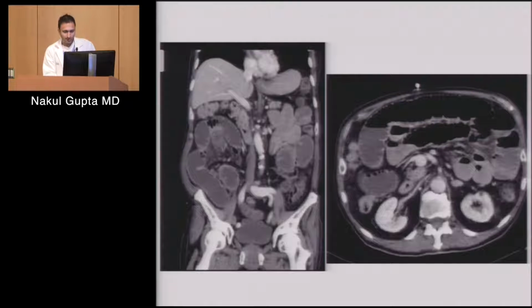And another area where CT is helpful in small bowel obstructions is to find the underlying cause. Again, mostly it'll be adhesions, and what you'll see there, you may not actually see the adhesion itself, you'll just see the bowel come to the sort of bird's beak appearance right at the transition point. But if there's an obstructing mass or something of that nature, you could hopefully see that with CT. And then another thing is to look for complications of the obstruction, meaning do they have bowel ischemia? We'll get to some of that later too, though. Let's not get ahead of ourselves.